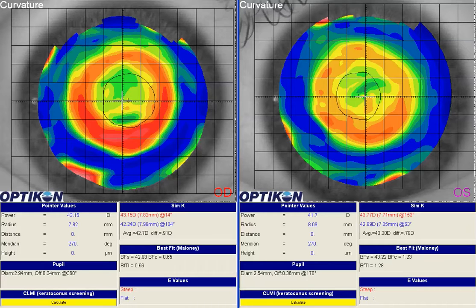This is an orthokeratology case where the patient is slightly undercorrected after treatment and also has some residual astigmatic prescription that's coming through the post-wear refraction. If we look at the post-wear topographies, getting pretty good centration of both lenses, and let's go ahead and bring those up.